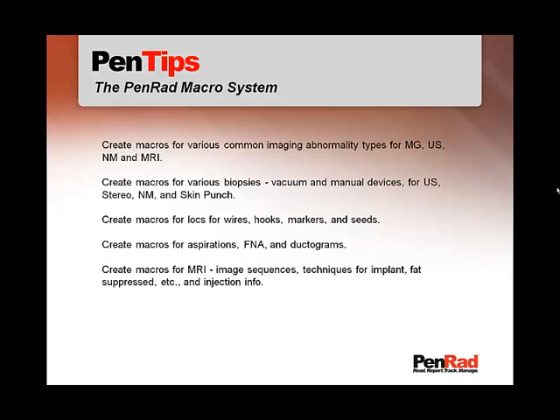Create macros for MRI, for image sequences, techniques for implant, fat suppressed, etc., and injection information. Create macros for nuclear medicine or BSGI, for image views and injection information.